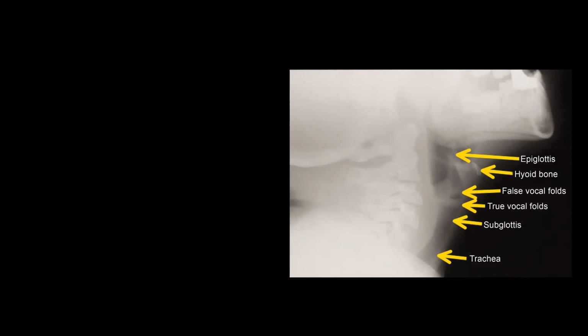and you can see this is the trachea, air in the trachea, so it's a tube-like, and behind will be the esophagus. So the true vocal cords is a lighter band, gray like you see, and the epiglottis is also a gray one, but very thin structure. You see here, the gray one.